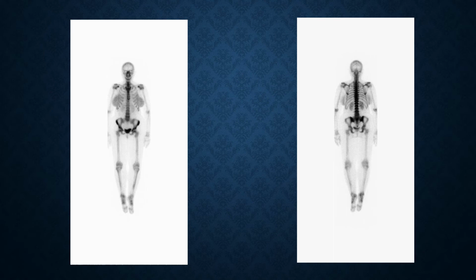We already mentioned earlier how bone scans aren't the best imaging modality anymore for certain pathologies, but I thought I would include bone scans of a patient with medial tibial stress syndrome. As we've mentioned previously in this class, bone scans are going out of vogue since they expose the patient to a lot of radiation and oftentimes are unable to discern chronicity.